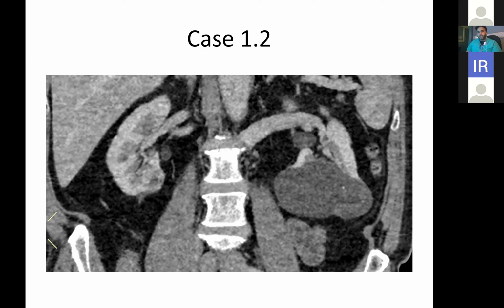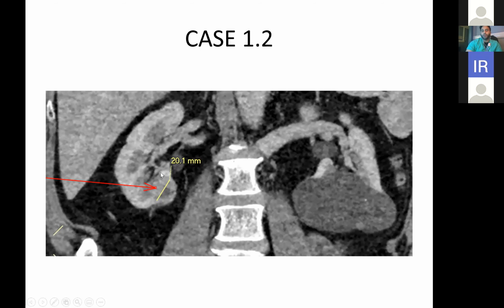Yeah, so certainly this patient did come in with left-sided abdominal pain and discomfort. When actually, if you look at the CT, if we were able to actually go through the CT slices, this is actually a renal cyst here. In fact, the lesion is actually situated in the lower pole of the right kidney. So this is a 2-centimeter lesion situated in the lower pole of the right kidney.